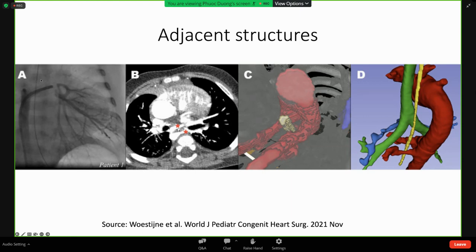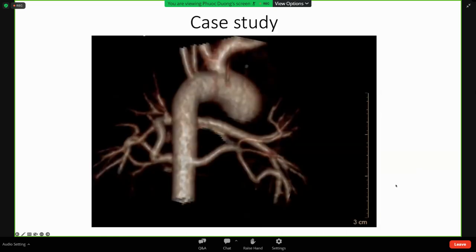the temperature probe going into the stomach, in this case a nasogastric tube, going into the stomach here. This is highlighted in the structure here. It goes in between the MAPCAs, and normally when we just look at this, it's quite hard to appreciate that there could potentially be something in between, and that's the point of this. You can actually see additional adjacent structures like airway and esophagus, and factor this into procedural planning.